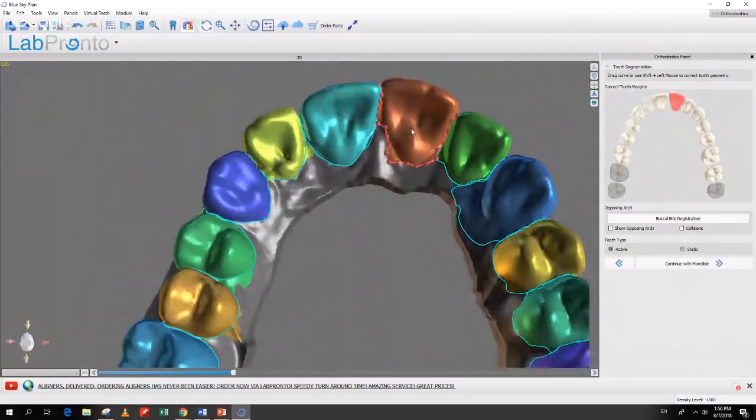And it even has the capability to draw a curve that's not even connecting the 2 nodes that are there. So you could just freehand the line where you want it to be, and the software will move the curve to that location.